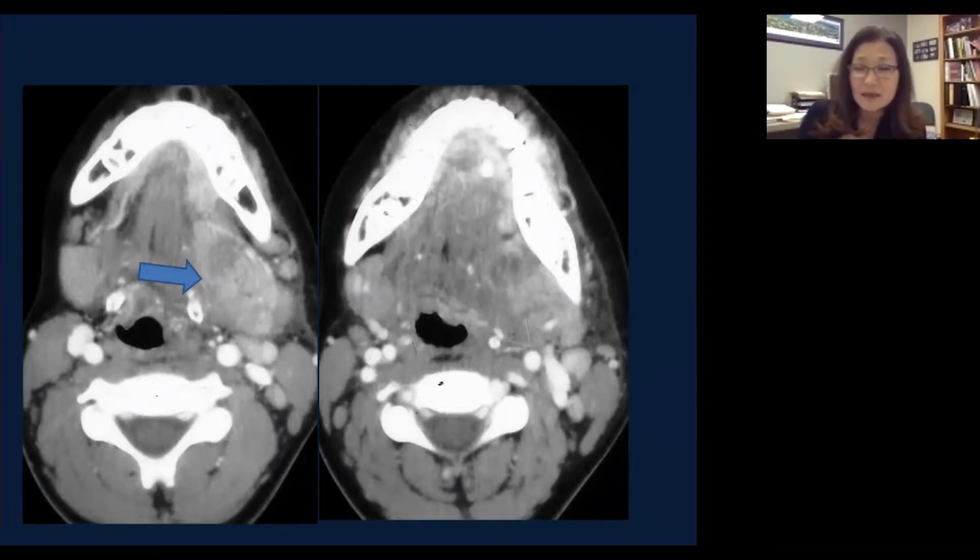As I said, the submandibular duct opens into the sublingual space, which is in the floor of the mouth. You really need to look far anterior to see what's going on in the floor of the mouth, and notice a focal area of a large stone obstructing the submandibular duct. So this is sialolithiasis with submandibular gland infection.